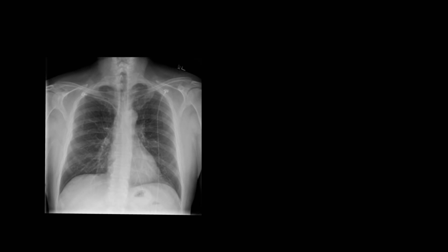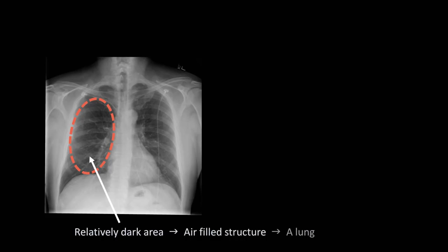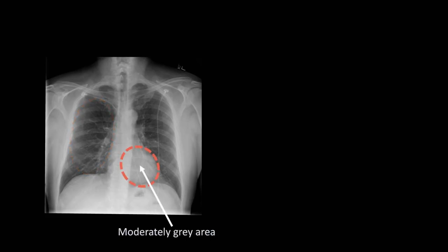From the pattern of white, black, and gray, we can infer things about those chest structures. For one, this area here, because it is generally relatively dark, must correspond to an air-filled structure, a lung. This area here, which is a medium gray in brightness, must correspond to a structure composed of either fluid or soft tissue, in this case the heart. Since the layout of the human body is amazingly consistent from person to person, each major line and shape on this X-ray corresponds with a known and identifiable anatomic part.